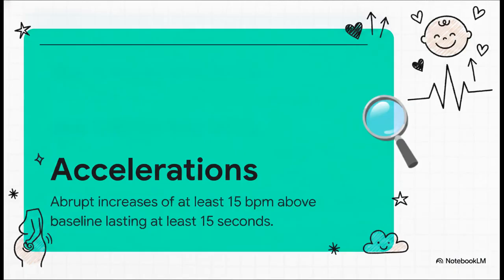Okay, accelerations are those highly reassuring signs of a happy, well-oxygenated baby. We define them as abrupt increases of at least 15 beats per minute above the baseline, lasting for at least 15 seconds. You'll often hear this called a 15 by 15. They pop up all the time with spontaneous fetal movement, and you know what the best part is? They require absolutely zero nursing intervention. Seriously, you just document it, smile, and keep going.